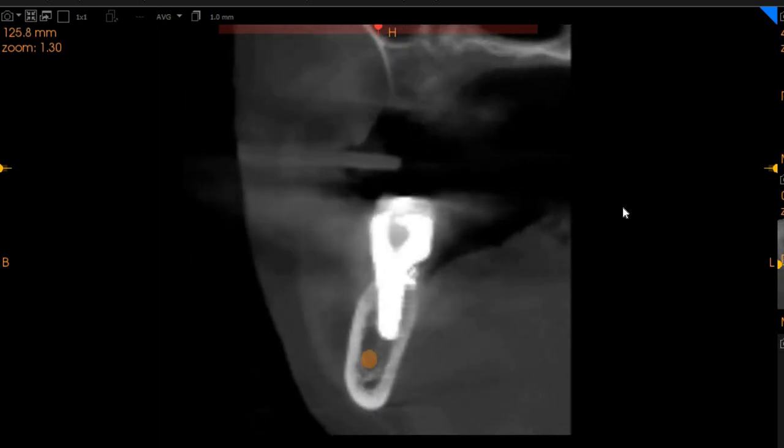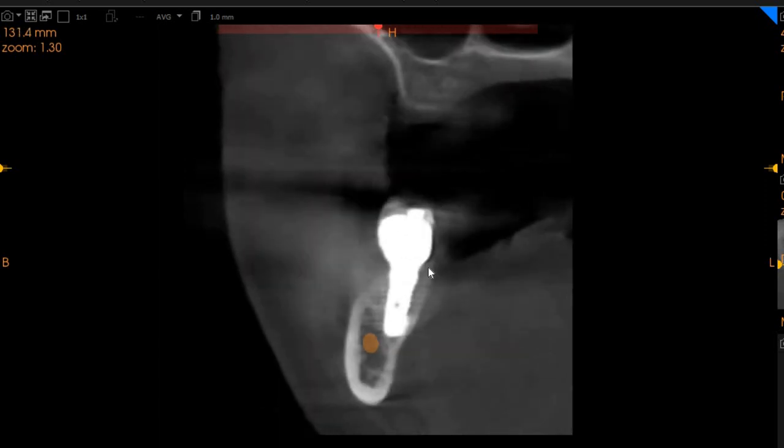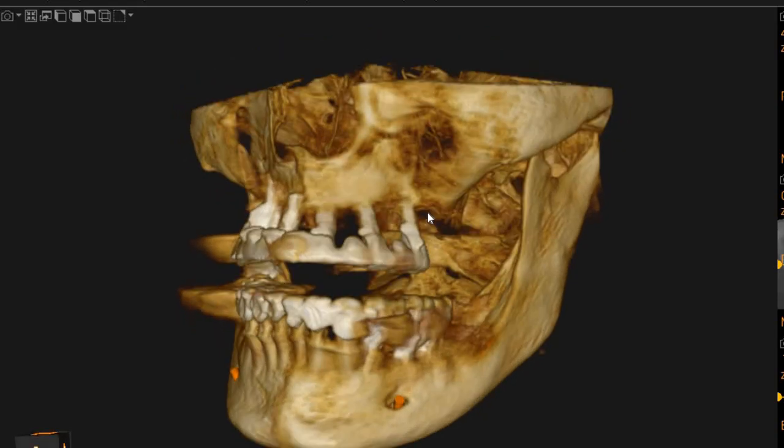Then we've got the second last tooth. Again, this implant has very good bone around it. And then the distal most implant, again, the ridge was quite lingually placed, but this implant is placed center of the ridge and has good bone support on the buccal as well as the lingual aspect. So the lower implants can definitely experience a change in prosthesis.